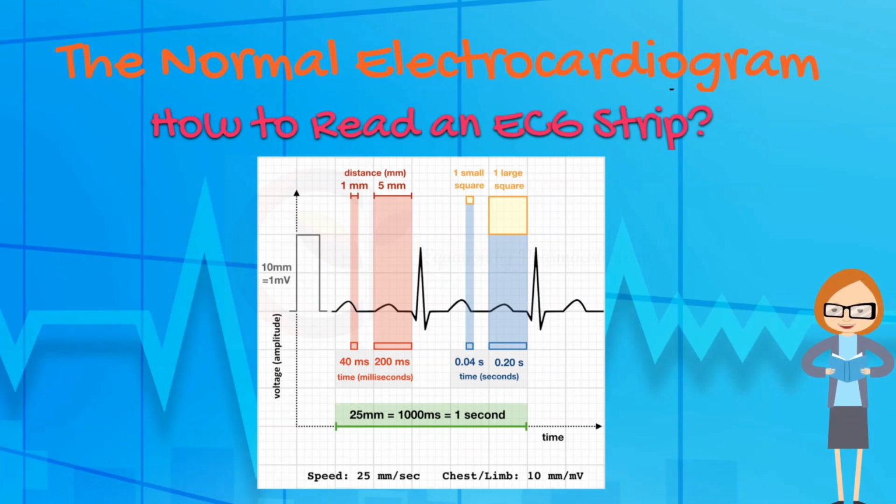At the beginning of an ECG, note of the standardization square is made, normally 10 mm high by 5 mm wide. This will alert to correct the paper speed and standard amplification of P, QRS, and T wave complexes. 1 mV of electrical activity results in a 10 mm vertical deflection on the grid paper.